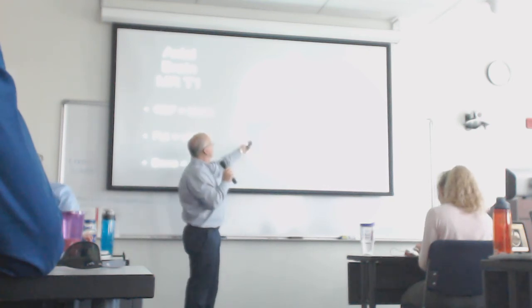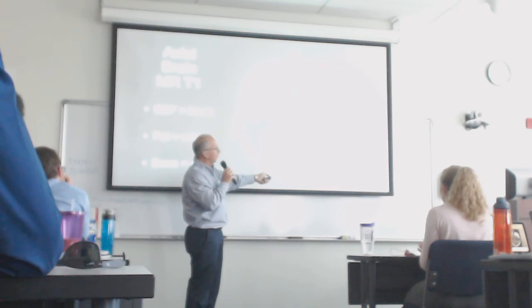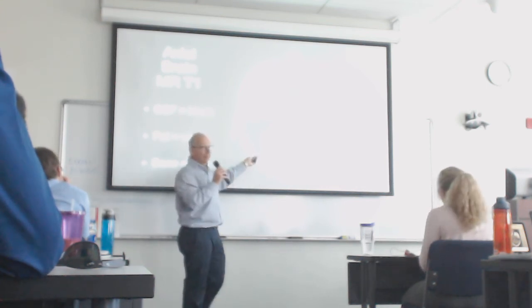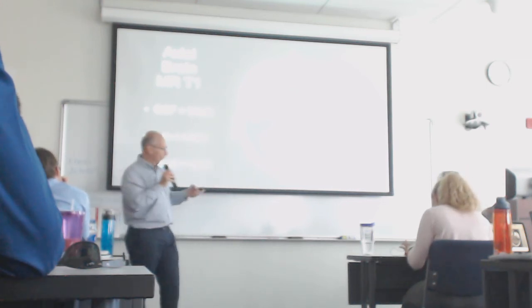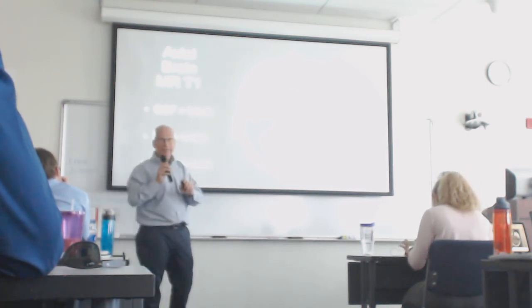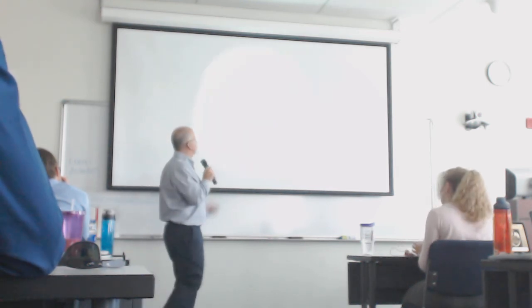So I know that there's a lot of fat around the orbits, around the globes inside the orbits. And notice how white that is. I know there's a lot of fat in the scalp, outside the skull. So that's where that's white. But I also know that on T1 weighted images, water is dark, it's black. Okay. Just like on a CT, where water is black. On a T1 weighted MR, water is black.